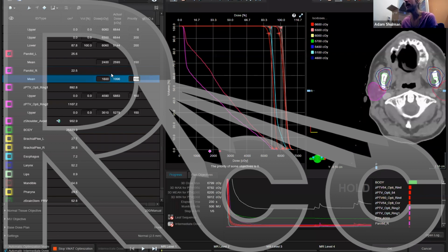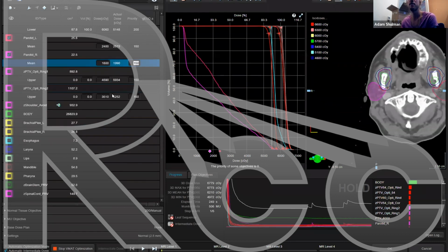It's been pushed enough at this level, leaving these weightings the same. You don't want to touch these weightings. Targets are at 200. OARs are at 150. Normal tissue, if you have Eclipse, is at 200. Leave all these weightings alone. Just optimizing this process, it'll work out. Okay, so we're sort of done with the parotids for now. We'll come back and look at them, and we'll look at these other organs at risk.